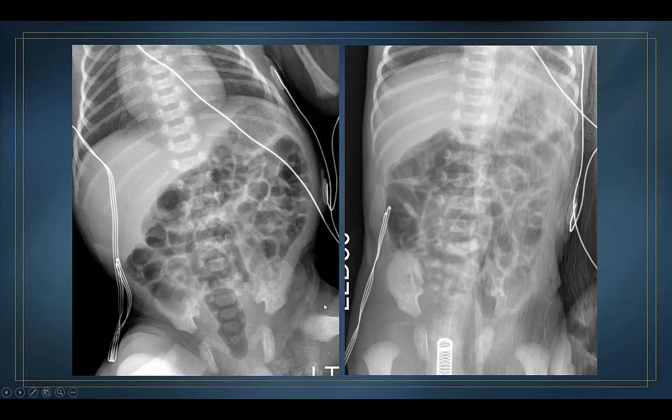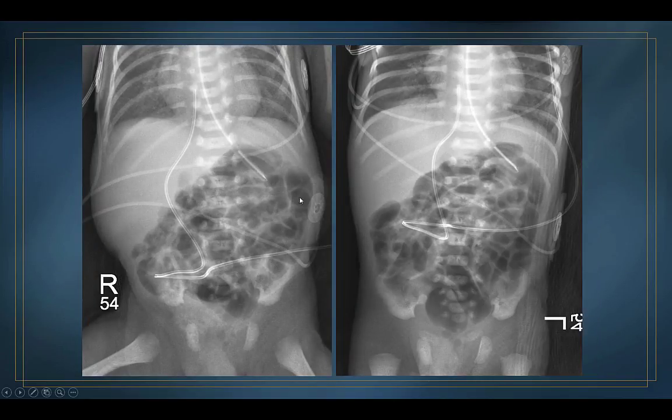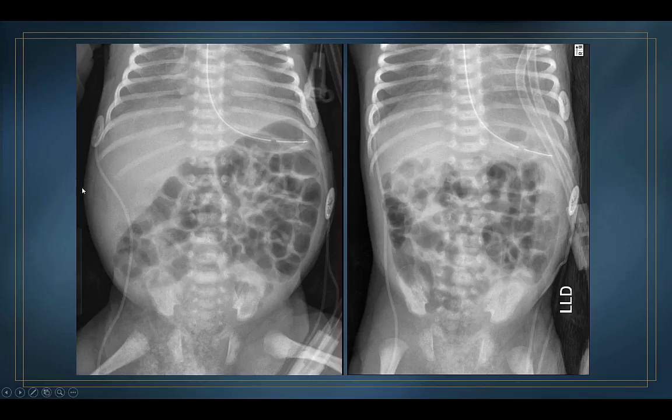Same thing, maybe a little bit worse. Again, I don't see any small bowel loops lengthwise. I don't see any air fluid levels. Maybe a little bit worse of the same thing. I mean, there are some elongated loops, but probably they're going to be colon, although I told you, be careful if you make that assumption. Some people might have called this maybe slightly asymmetric, and do a follow-up film. Again, relatively normal. Everything's sort of the same size. No air fluid levels on the decube.